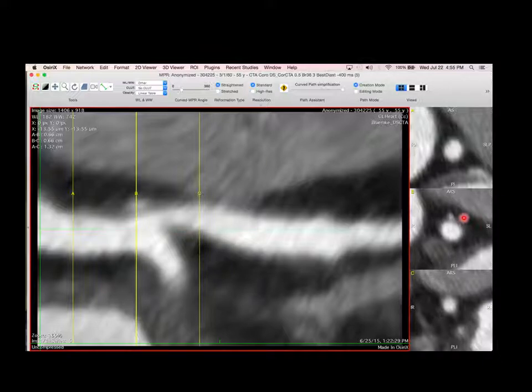If you have some kind of inflammatory injury to the inside of your vessel wall and it gets repaired by natural events, it usually leaves behind some chunks of calcium, right? And you develop these as you get older. So that's a chunk of calcium. This probably is a soft plaque, an active lesion surrounding this piece of calcium.